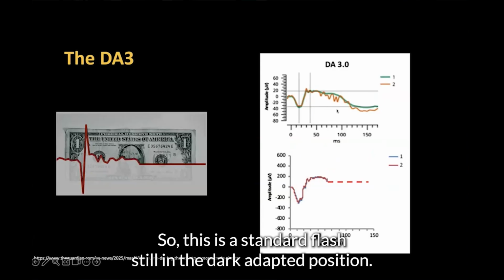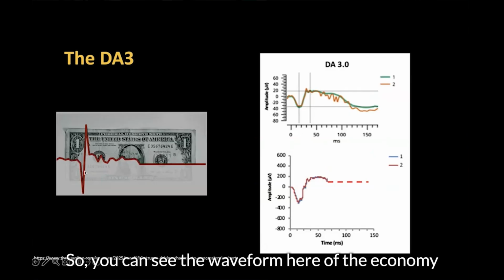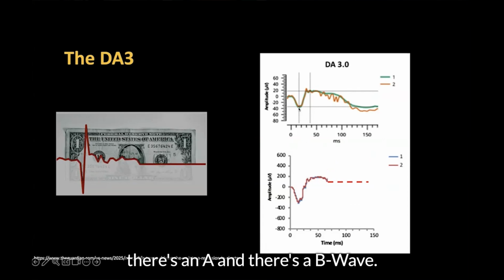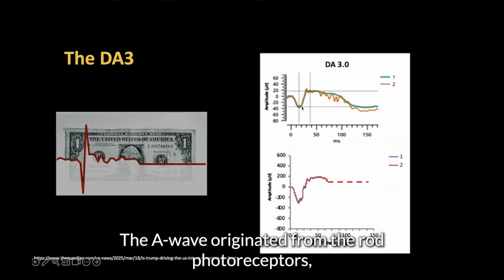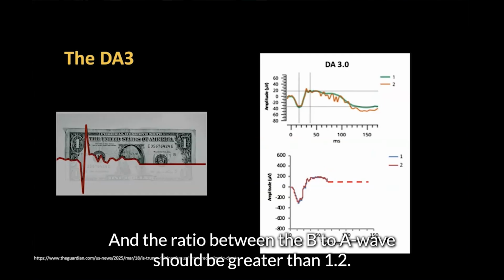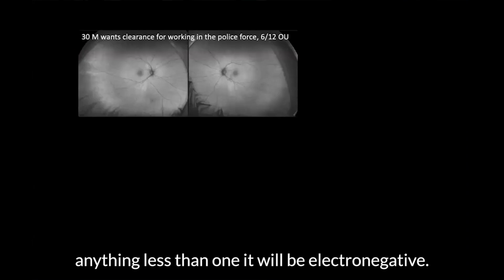Next is the DA 3. So this is a standard flash, still in the dark adapted state. So you can see the waveform here. There's an A and there's a B wave. The A wave originates from the rod photoreceptors, whilst the B wave comes from the bipolar cells. And the ratio between the B to A wave should be greater than 1.2. Anything less than that will be reduced. Anything less than 1 will be electronegative.